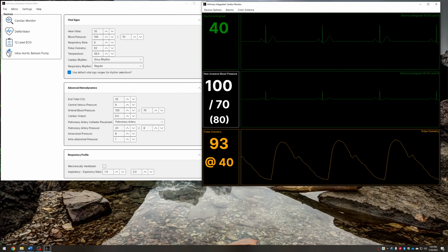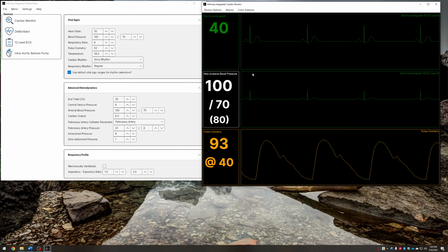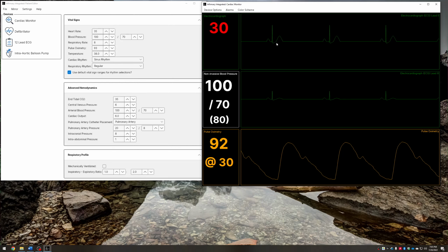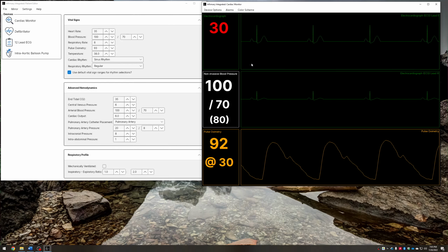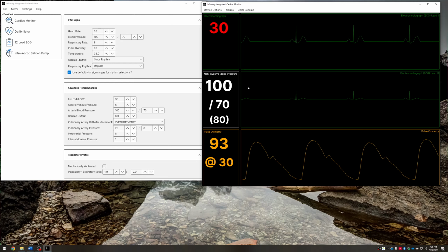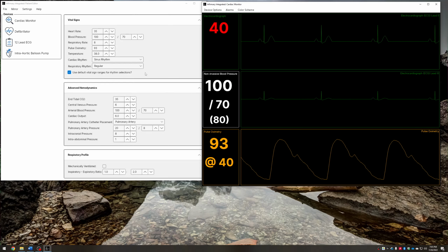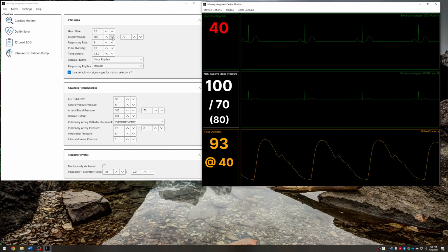There is a way to edit, using the scenario editor, what the priority alarms are, how much of a priority those alarm noises come out to be, whether it's a triple beep, a double beep, or a single honk, and which parameters will reflect into the alarms.